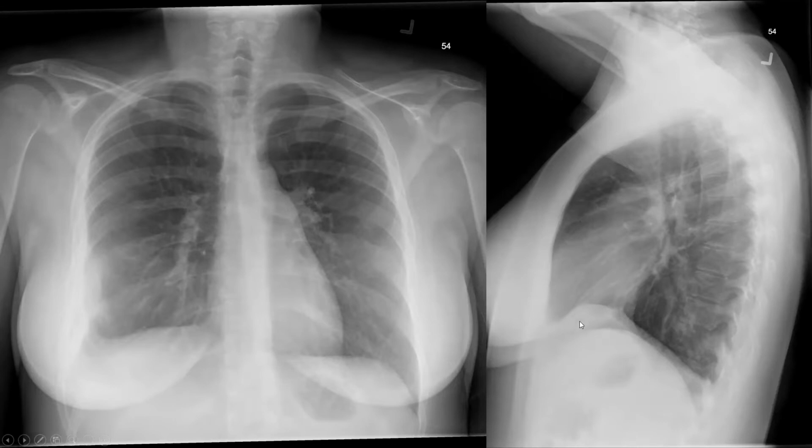And if you look on the lateral, you see this little area right here, a little bit abnormal, certainly not strikingly so. But because her infant had congenital tuberculosis, this is concerning for active TB pulmonary disease in this woman. And further history was obtained and discovered that she's an 18-year-old, otherwise healthy young woman who was born in the US, but had traveled to Mexico for some time.